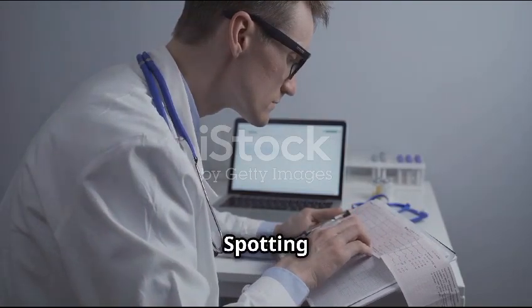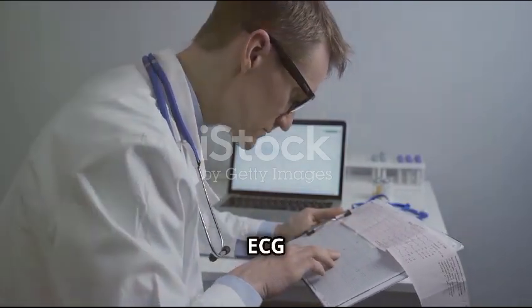Section 5. Spotting the red flags. Recognizing common ECG abnormalities.